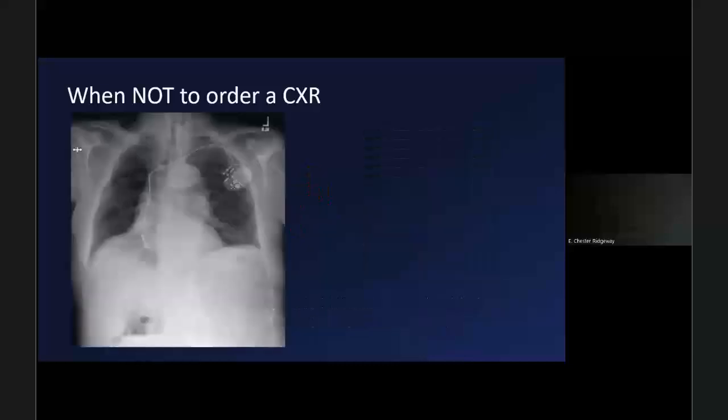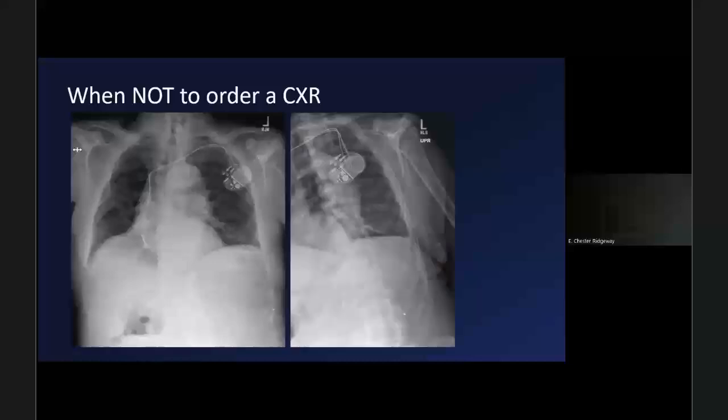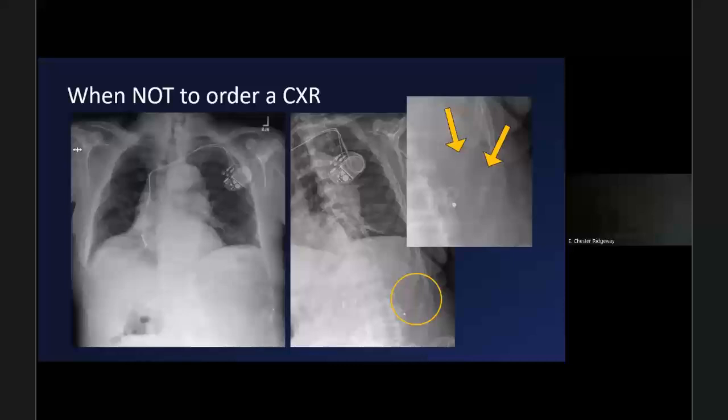All right, so this person has rib fractures. Where are they? I don't know. All right, so we're going to zoom in. So now here's our oblique view. Now we can see where those rib fractures are very nicely. There they are. They correspond with that radio-opaque BB that we put on these patients if they can actually point to where their pain is. And I'll give you this zoomed up version here. Again, those arrows are pointing out where these mildly displaced fractures are. In hindsight, could I go back and say, yes, I see these rib fractures on the frontal chest view? Maybe, like 50% of the time. But prospectively, it's very difficult for us to find these.